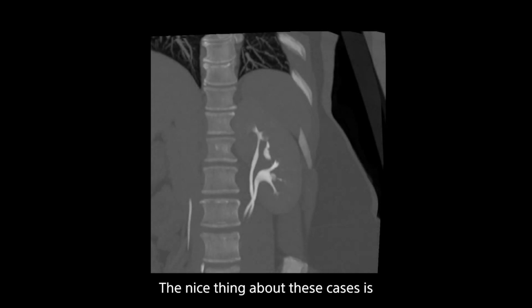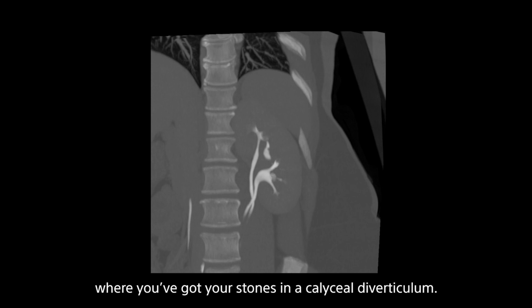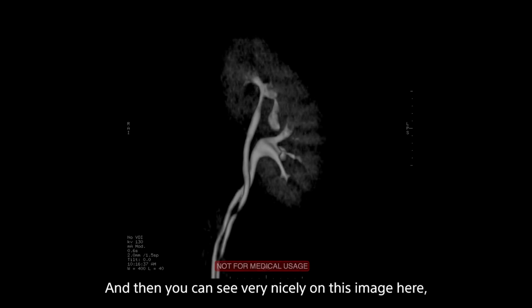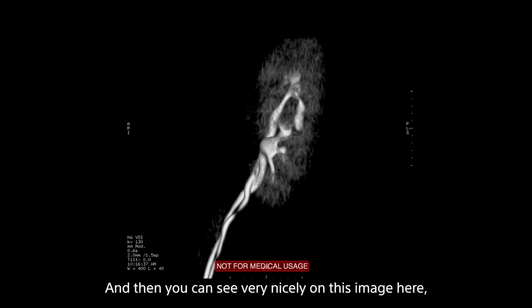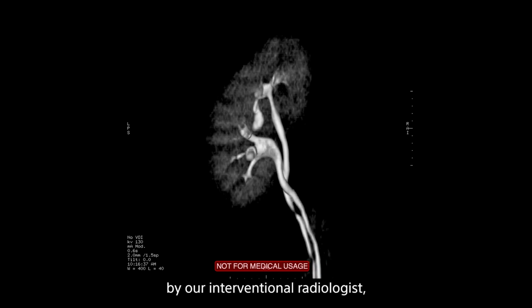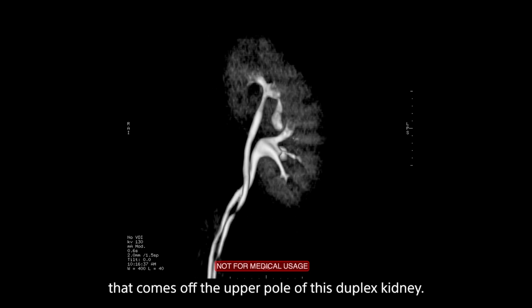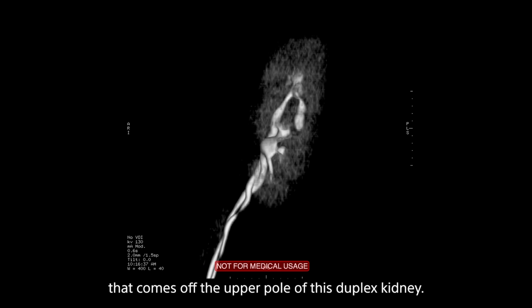Nice thing about these cases is it's a duplex all the way down to the bladder. You can get a very nice reconstructed model here, which shows in this coronal section the duplex system, but then also the area where you've got your stones in a calyceal diverticulum. And then you can see very nicely on this image here, which is this reconstructed image made by our interventional radiologist, you can see very clearly how tight that calyceal neck is, and you can see the cavity there that comes off the upper pole of this duplex kidney.